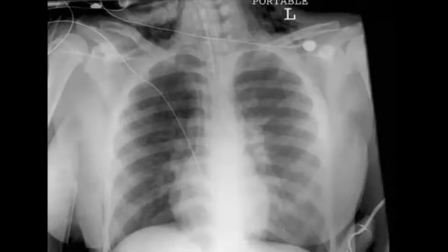this is like an adolescent girl, and you can activate your checklist, try to find the abnormality: pneumonia, pneumothorax, pneumomediastinum, consolidation, coarctation, collapse, and start to look in the review areas.